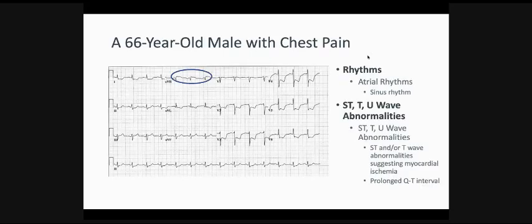If you concentrate, you will find an ST segment depression there, so you don't have to put this as a posterior myocardial infarction unless you are faced with an inferior ST segment elevation. But the presence of ST segment depression in this case tells you that there is myocardial ischemia rather than an infarction, and that ischemia is very evident in the septal, anterior, and lateral walls as well. So avoid coding this as a posterior myocardial infarction. This is an ischemia. If you find any ST segment depression in the exams, this is myocardial ischemia until proven otherwise.